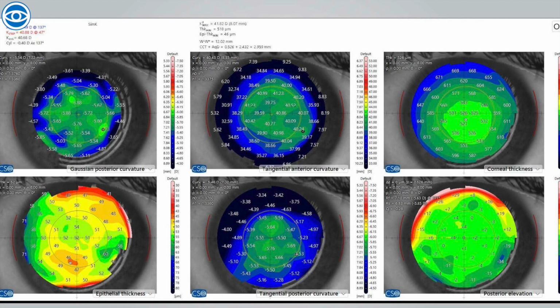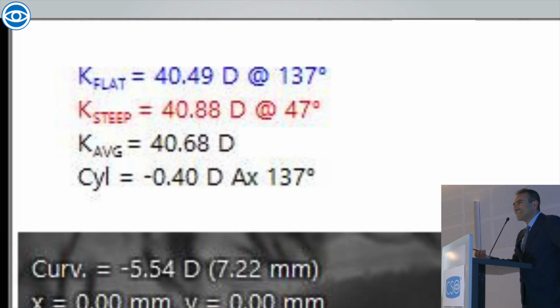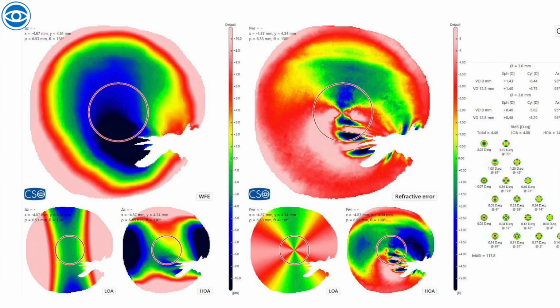I look at the MS39 and it's like, that's weird. His corneal astigmatism is almost nothing. Where does this astigmatism come from? And the patient swears that he didn't have that astigmatism before. He swears that he always saw well in the other eye. We always thought that maybe the patient is just looking binocularly and he didn't know. But I didn't want to be the third doctor telling him it's nothing.